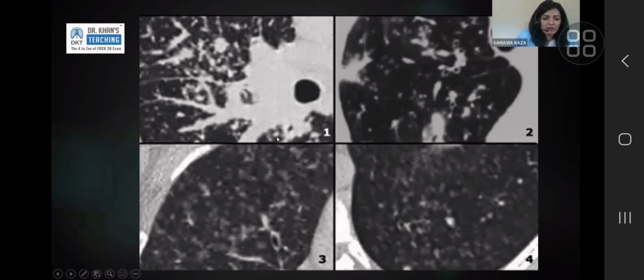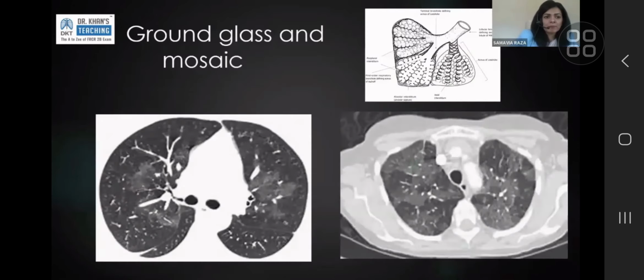Number 3, if you look at the pleural surface, you can see that there are nodules going all the way up to the pleural surface. In some places they are, in other places it's not. The bronchovascular bundles are smooth, they're not nodular. The pleural surface on the other side looks smooth. There are quite a lot of nodules, but they're not specific to any location. They're not central lobular looking. They're not peribronchovascular looking. So the only pattern that remains here is random. So that's random nodularity, differential being TB or metastases.